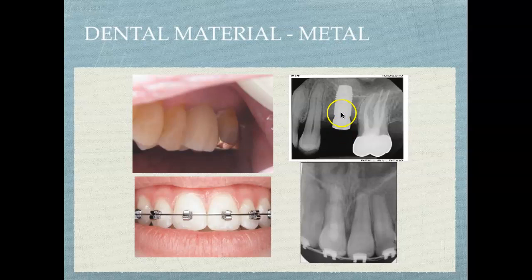So an implant is metal. As these two, the photograph and the radiographic image, were taken at two different times, while tooth number 14 has a crown, you do not see the crown here. It doesn't mean the crown's invisible. It just means that they were taken at two different times.